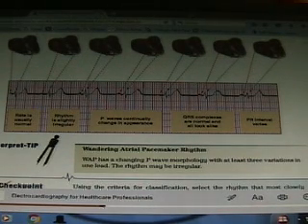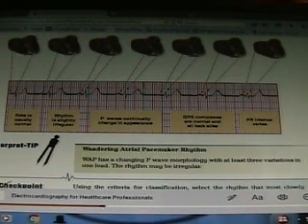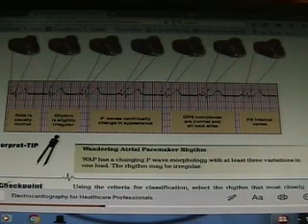And I'll even give you a hint on exams. I'll even tell you this is abnormal. And then you must tell me what? What's abnormal? So, what's the abnormalcy in WAP? It's only slightly irregular. It's not like the PAC. The PAC, you see it was regular. You definitely know. Right? The rate looks normal, 60 to 100. But what do we notice about the P waves? So that's one question I could ask you in WAP.